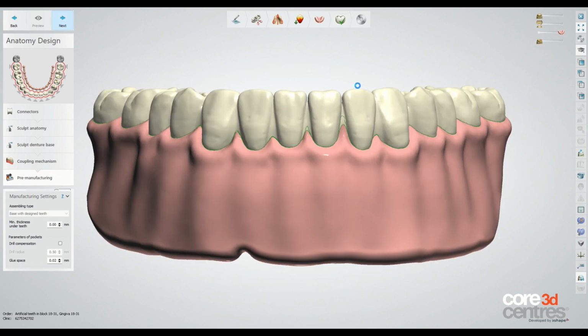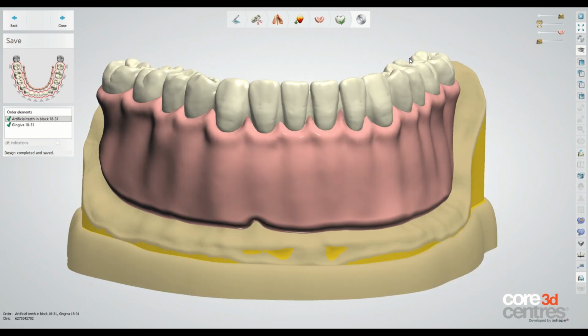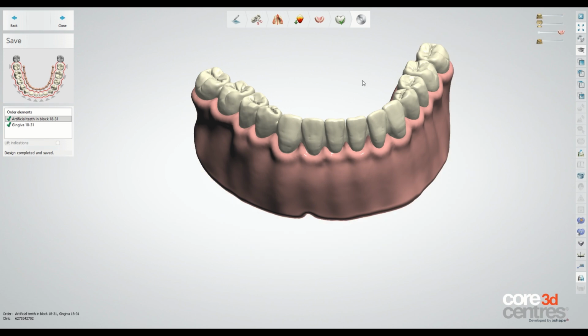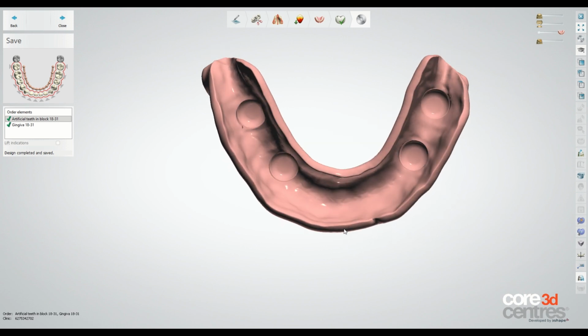Or you can provide the doctor with the ideal cuff height indicated for each implant for them to acquire separately and send the denture without housings to have them pick up the denture chairside instead. Simple. Please stay tuned as Preat will continue to evolve this tool in surprising ways that will further simplify the process to make and deliver PreatLoc digital dentures in a better, more efficient way.